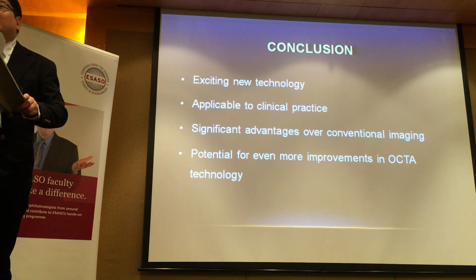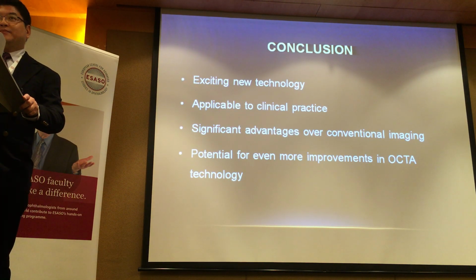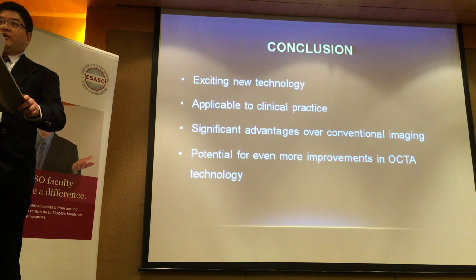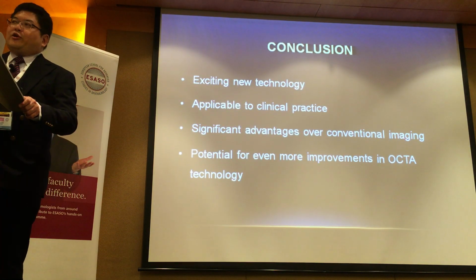Sir, how do we differentiate hemorrhages from actual capillary drop-off in the OCT? Yes. So the question is, how do we differentiate an area of hemorrhage from capillary dropout? That's a good question, and you bring up a good point.